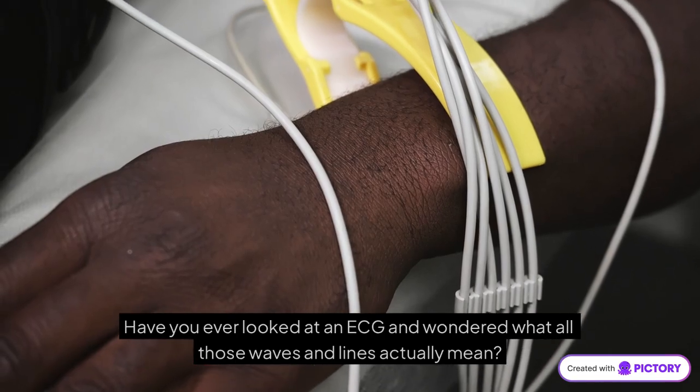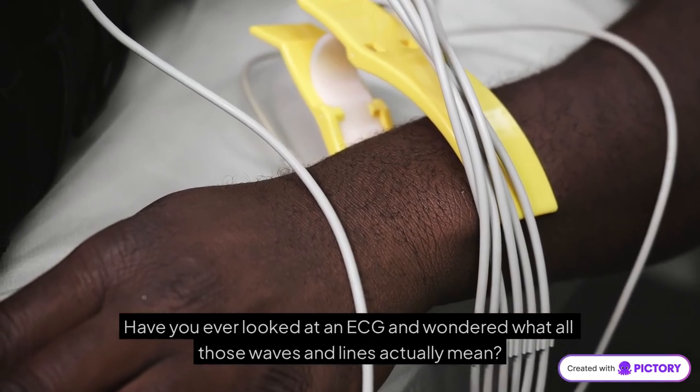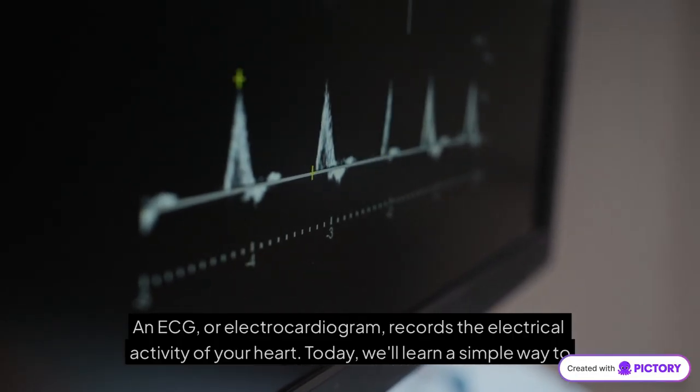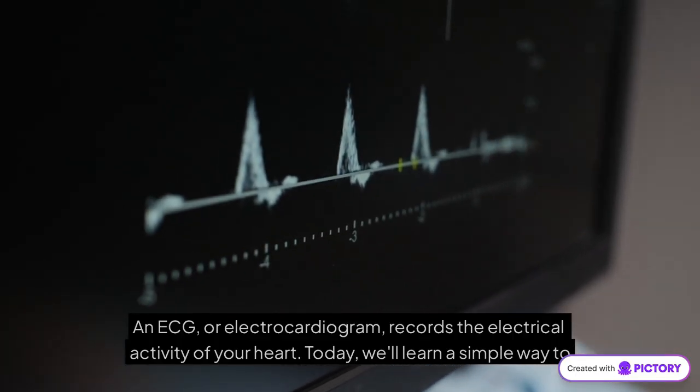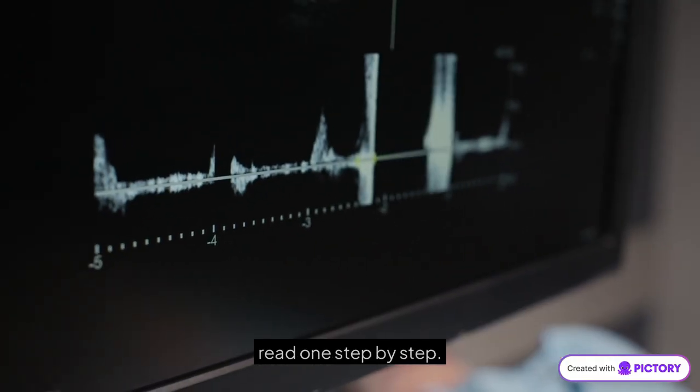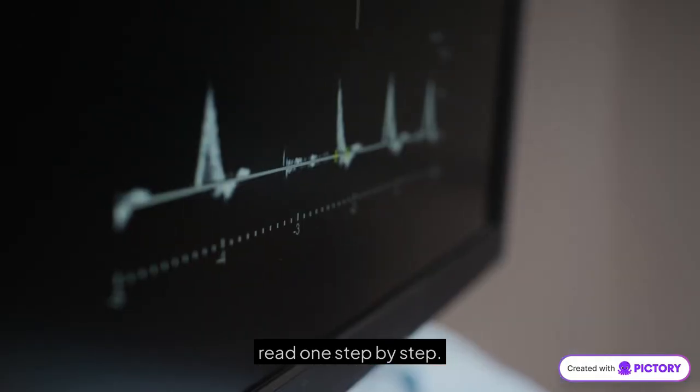Have you ever looked at an ECG and wondered what all those waves and lines actually mean? An ECG, or electrocardiogram, records the electrical activity of your heart. Today, we'll learn a simple way to read one step by step.